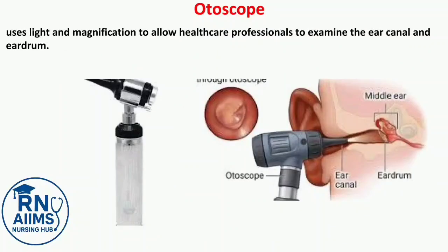Otoscope. Uses light and magnification to allow healthcare professionals to examine the ear canal and eardrum.